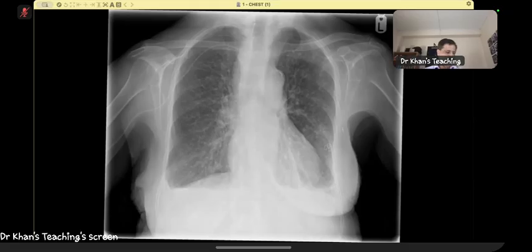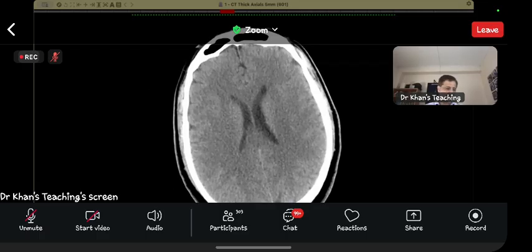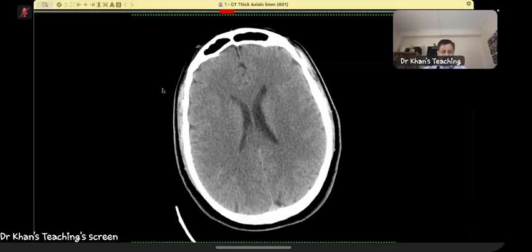Okay, well done. Now we go to the last case of the day. Okay, candidate two. This is a 47-year-old GP outpatient, chronic headache. Over to you. The mouse is with you.